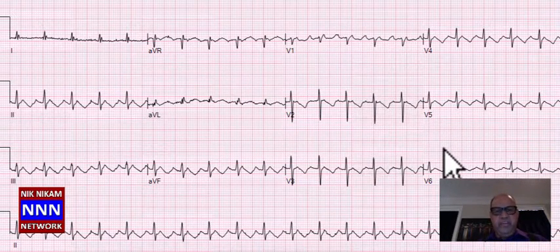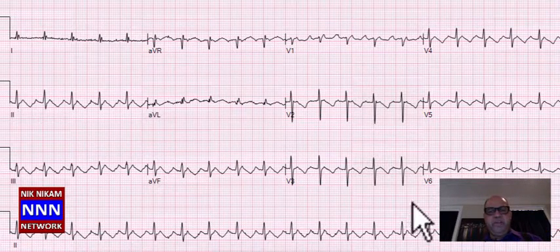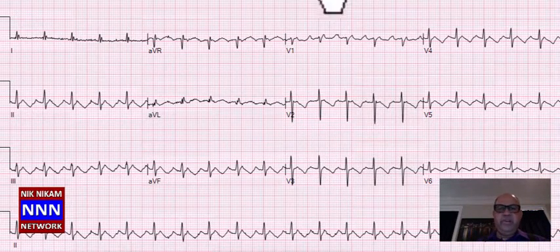This is a classic example of atrial flutter, so don't forget this picture. It's just like when you look at someone, you fix their picture in your mind. This is the atrial flutter picture. You need to fix this, the sawtooth appearance that we see here, and next time when you see something like this, you should instantaneously jump up and say that is atrial flutter with 2-to-1 conduction.